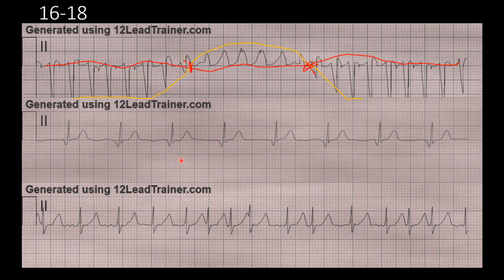But with our P wave being inverted, if that is a P wave, that tells us it's somewhere in the low atria because it's doing retrograde conduction. So if we have something that's not starting in the ventricles and not starting anywhere in the high atria or sinoatrial node, all that would leave is something that is in the junctional area, the AV junction.